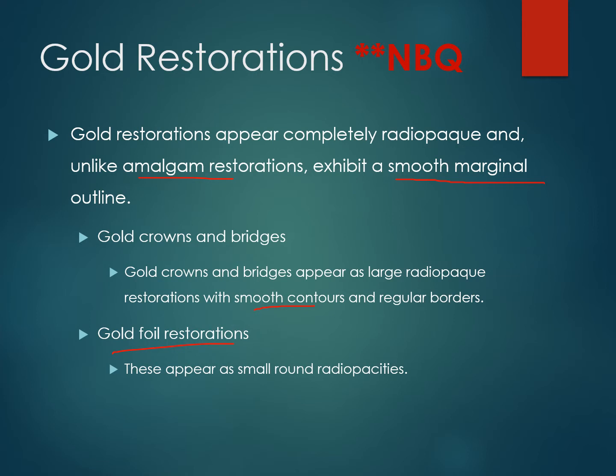They were not typically done very often because it was such an expensive material. Amalgam was better. Although gold is one of the best materials we can place in someone's mouth because it is more malleable. It's a softer metal. And so, as the patient bites or grinds or whatever happens to it, gold is much more forgiving, and it doesn't break or chip as much as metal or porcelain does. So it's a really wonderful mouth restoration material. But gold foil was very expensive.